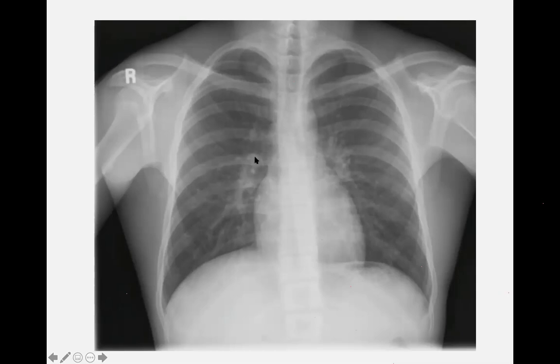And this is a bit white because of the hilum. As you know, the hilum is where the blood vessels enter the lungs and also where the bronchus enters the lungs. So that's why it appears slightly white, but that's normal. You don't want white opacities in these areas of the lungs, a bit more peripheral, so a bit further from this.